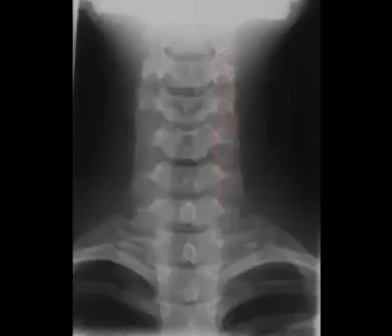Now, remember, we saw the joint space of the facets very well on the lateral projection due to their orientation. Well, on a frontal projection, we don't see through the joint space, and therefore these articular pillars look like one dense piece of bone. Lastly, spinous processes. Oh, got a little ahead of myself there. I said lastly, but we actually need to identify the TPs. Now, remember that the transverse processes do extend off of the body, and they're typically pretty small in the cervical spine. We're catching the margin of a few of them. These are not typically very well seen.